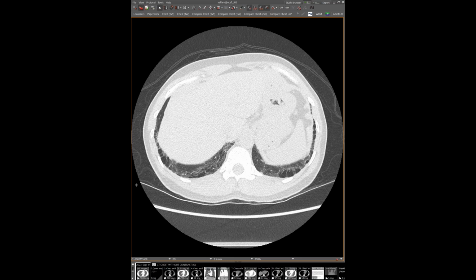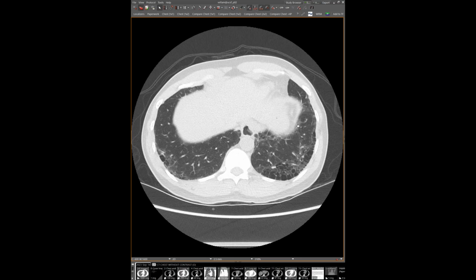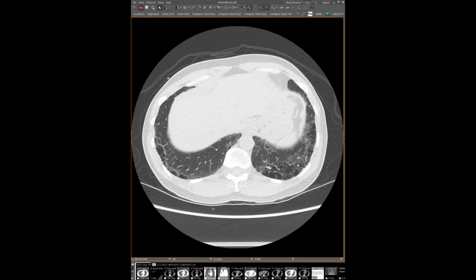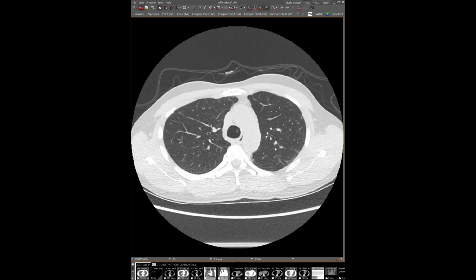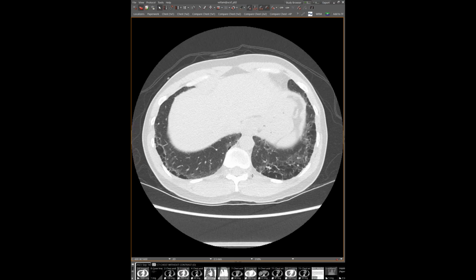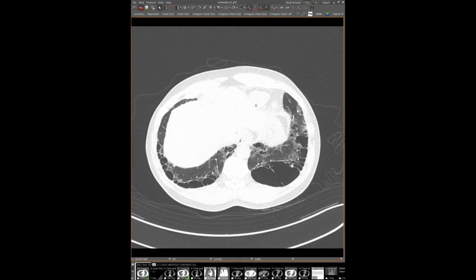Absolutely. I would say there's not a whole lot of fibrosis in this. Most of the walls of these big spaces are very thin. So I think you could call this paraseptal emphysema. And all it takes is macrophages to digest the lung. We had a recent case where it looked like your case here, except that it was flipped. The stuff was developing at the apices. The person did not have any known autoimmune disease, but had this progressive paraseptal emphysema or these peripheral bullae, whatever you want to call it, going on. But it was in the upper lungs and it was kind of mysterious.